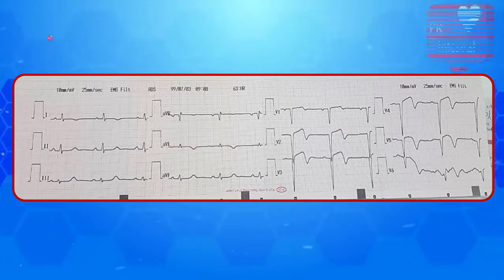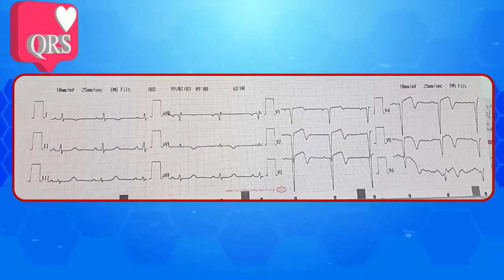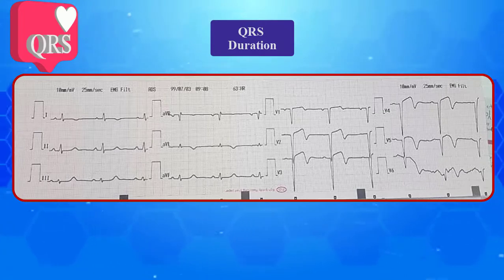Next part is QRS complexes. As usual, examine 4 items to establish the complex changes. 1. QRS duration. As we said in the second part, the QRS complexes are narrow. So, any form of conduction abnormality, including bundle branch block, WPW syndrome, hyperkalemia, or ventricular rhythm is absent.